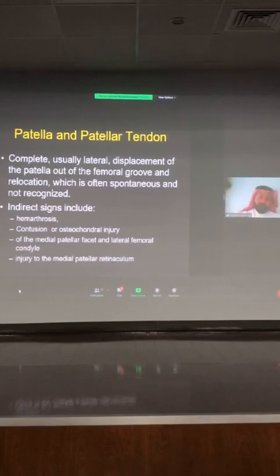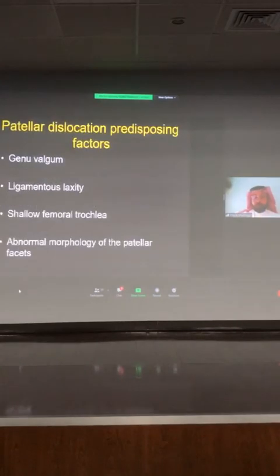And to assess the trochlear groove in this patient to see if there is patellar maltracking, to see if this patient is at risk of recurrent dislocations of the patella or not. So these are all very important issues.